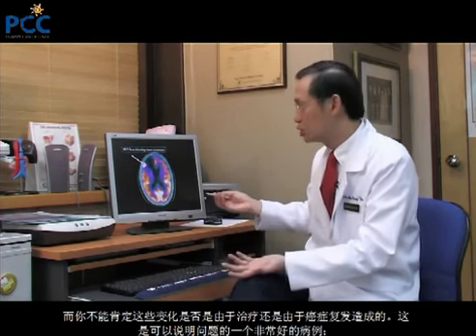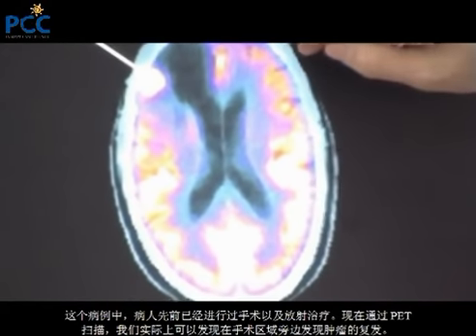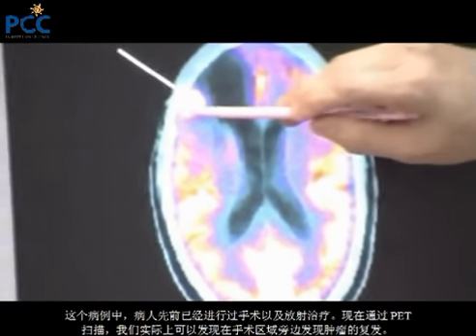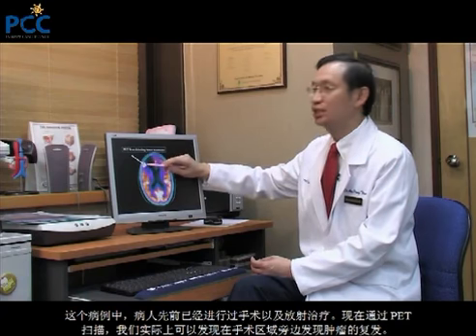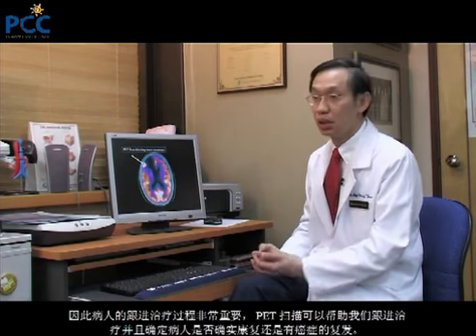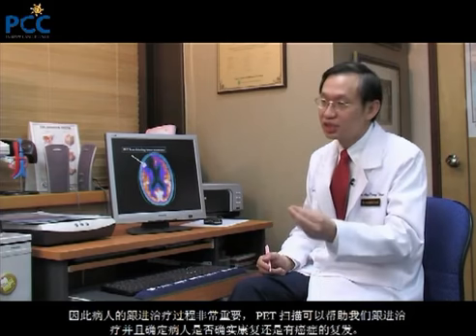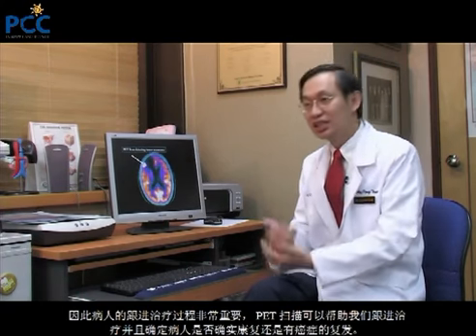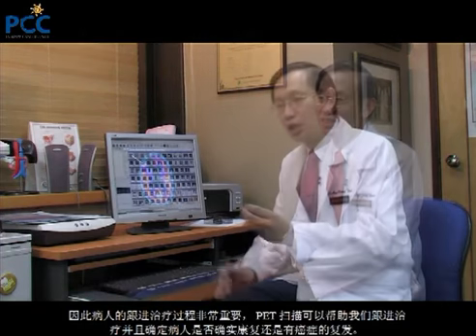This is a very good case to illustrate. It is a situation where the patient has had prior surgery and also radiation, and now through a PET scan, we can in actual fact detect a tumor recurrence that is just adjacent to the surgical site. So it is very important in the follow-up of patients to consider when a PET scan may help us to follow up and establish whether the patient is indeed disease-free or has a cancer recurrence.